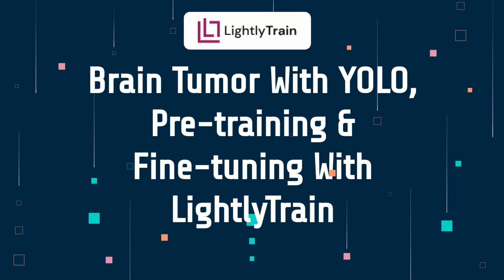So in this, let's get started, and I'm going to show you how to get started using LightlyTrain. Okay, so let's get started with it.